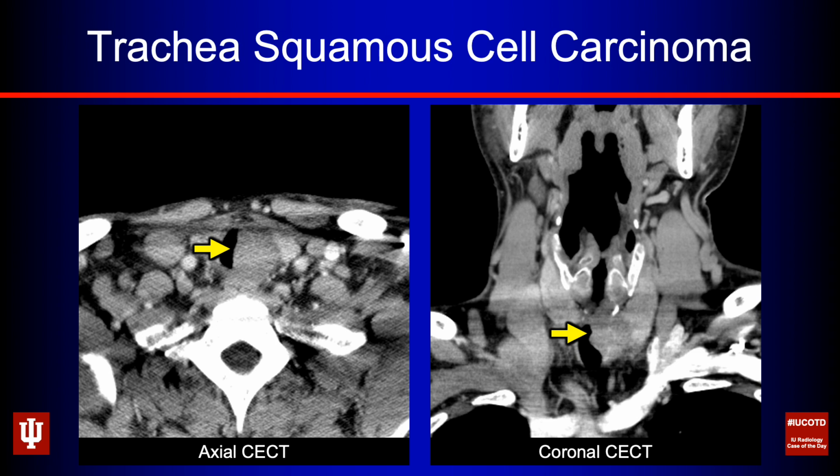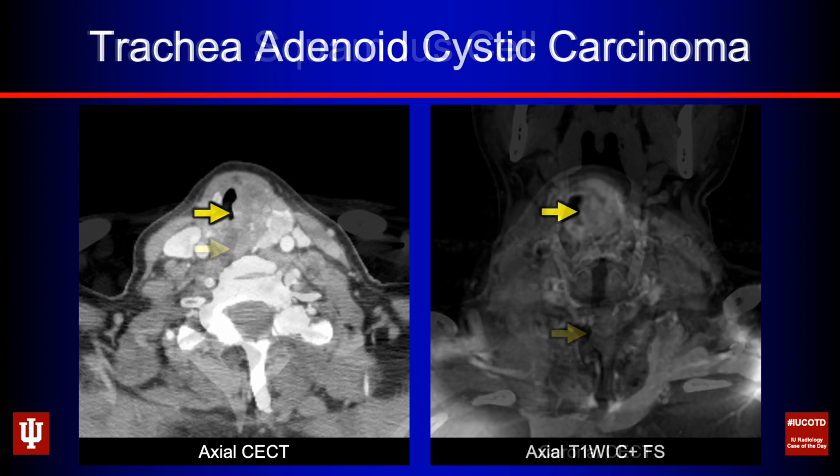There's nothing that I can say on this imaging that will tell me that this is certainly a squamous cell carcinoma. That just happens to be the most likely diagnosis based on the statistics.